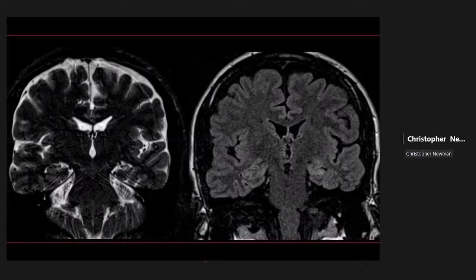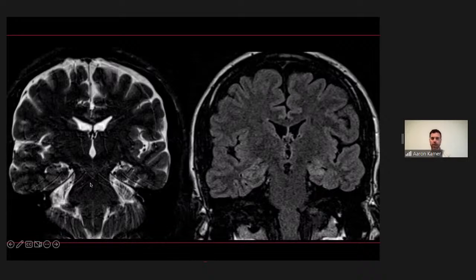May just be resolution. Yeah, I totally agree. And I mean, this is a great example of, I don't care whether it's a 3T or a 1.5. This patient was moving all over the place and it just made it look terrible, right? A lot of that loss of internal architecture is probably just because we've got really crappy images. I would be very tempted to just refer to this as a unilateral process and chalk up most of what we're seeing on the right as really bad images.